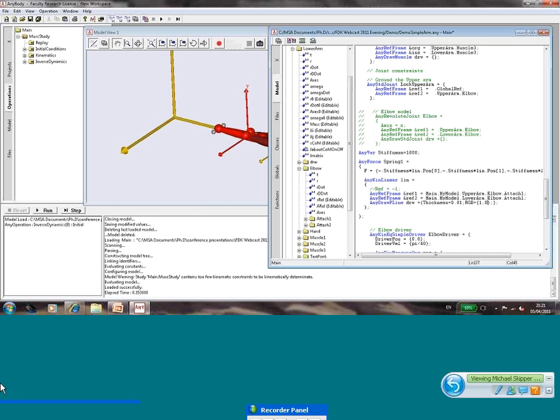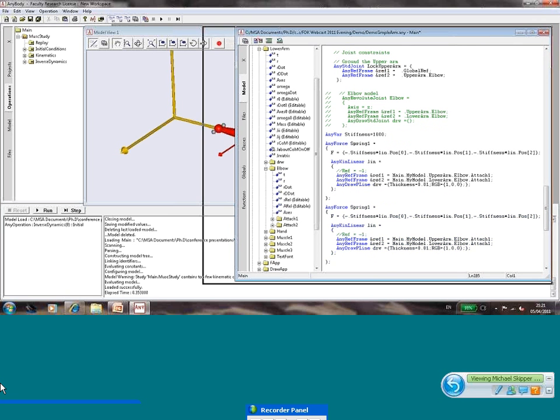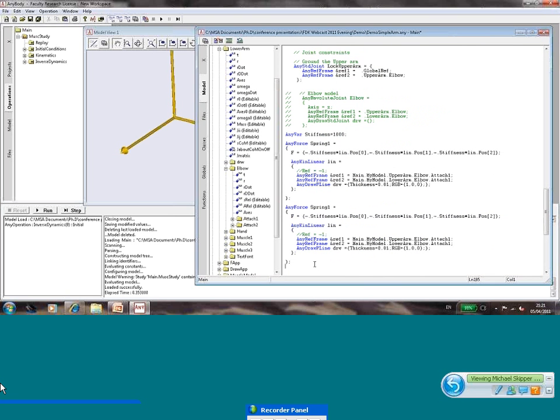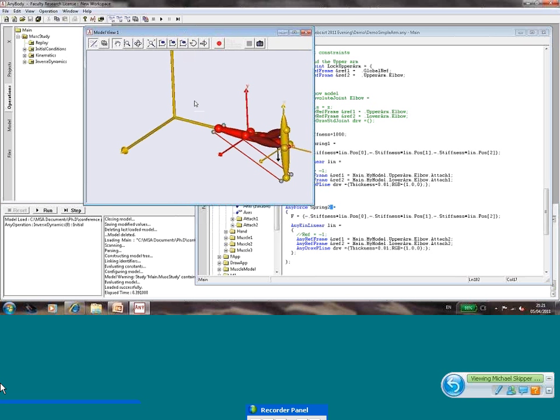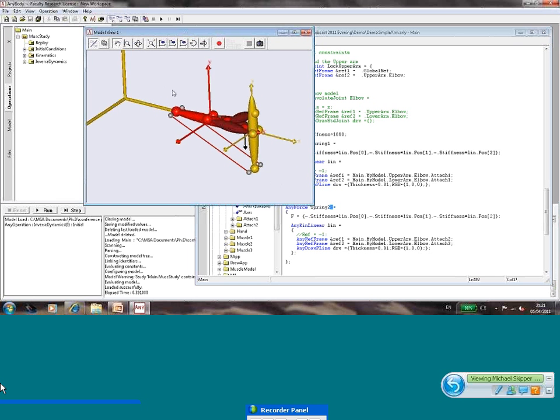So that was one thing, but I said I wanted two, so I will just copy this code and then replace the things I need to replace. And what I need to replace is that I want my vector to not be between attach 1 and attach 1, but I want it to be between attach 2 and attach 2. And then I, of course, need to call it something else. If I try reloading my model and look here, then now we have actually gotten two vectors, or we have gotten two lines between our two gray points in our model here.